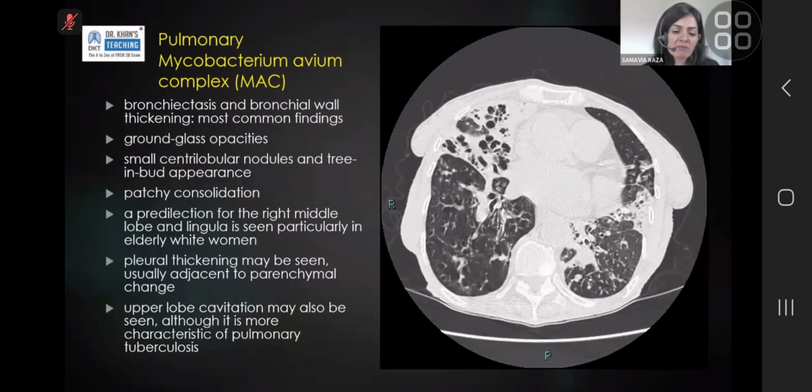It's a very typical appearance, let's say, on CT. And what I mean by that is, can you always tell that this is Mycobacterium? Yes, you can reasonably be confident that this is Mycobacterium infection, but you can't always be confident that this is NTM and not TB. So these patients almost always need endobronchial sampling to confirm one way or the other.